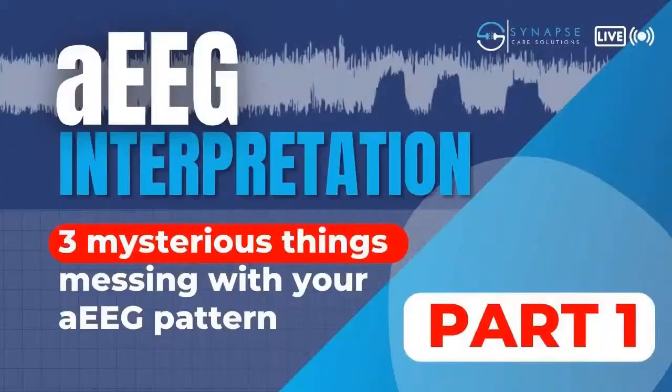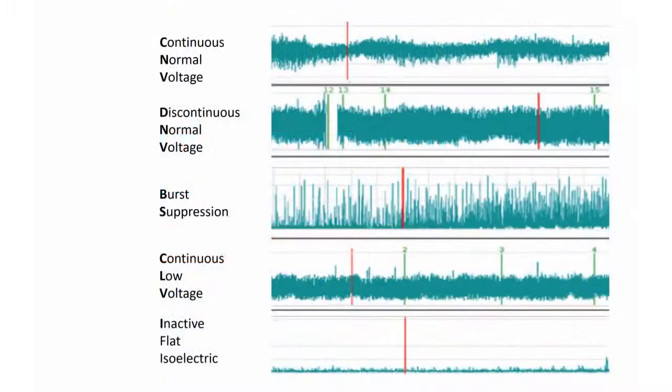So today's topic, I wanted to just do a quick refresher on our 5 basic patterns of aEEG, because I feel like we need to know this in order to understand how medications affect this. So for normal voltage, we always want the upper margin to be greater than 10, and for the lower margin to be greater than 5. So continuous normal voltage, we want greater than 10, but most important for continuous normal voltage is that the lower margin is always greater than 5.